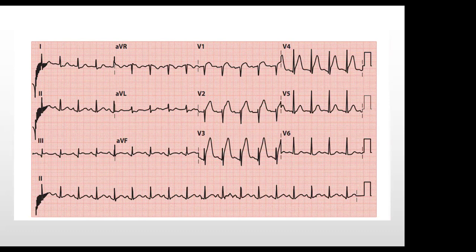At least you have V1, V2, V3. Or any other differential? Do you want to consider hyperkalemia?